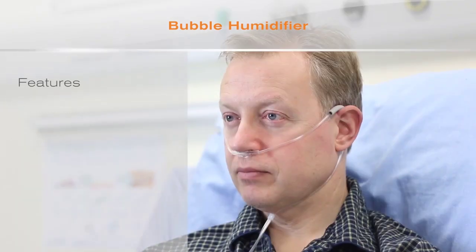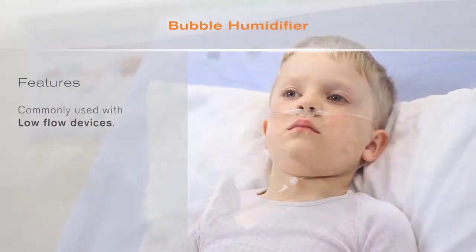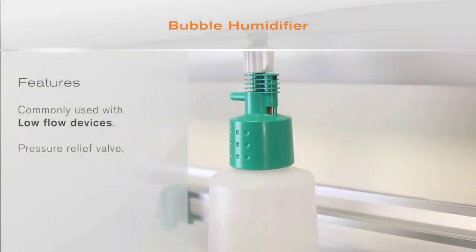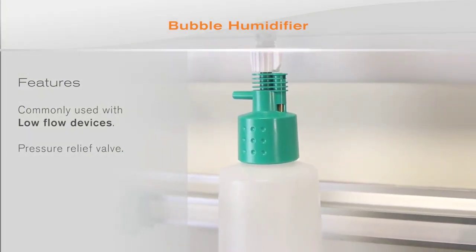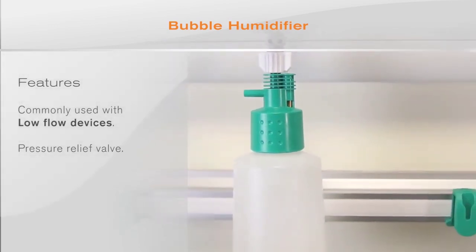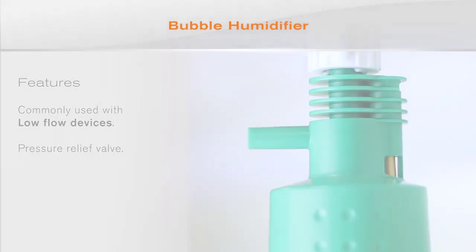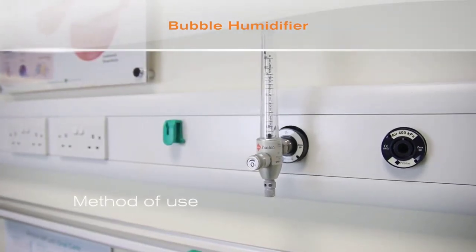Bubble humidifiers are most commonly used with low-flow devices such as nasal cannulae and medium concentration oxygen masks. Some models incorporate a pressure relief valve designed to prevent excessive pressures building up in the bottle should the oxygen tubing become occluded. Operation of the relief valve may also activate an audible warning, drawing the attention of the user to this problem.